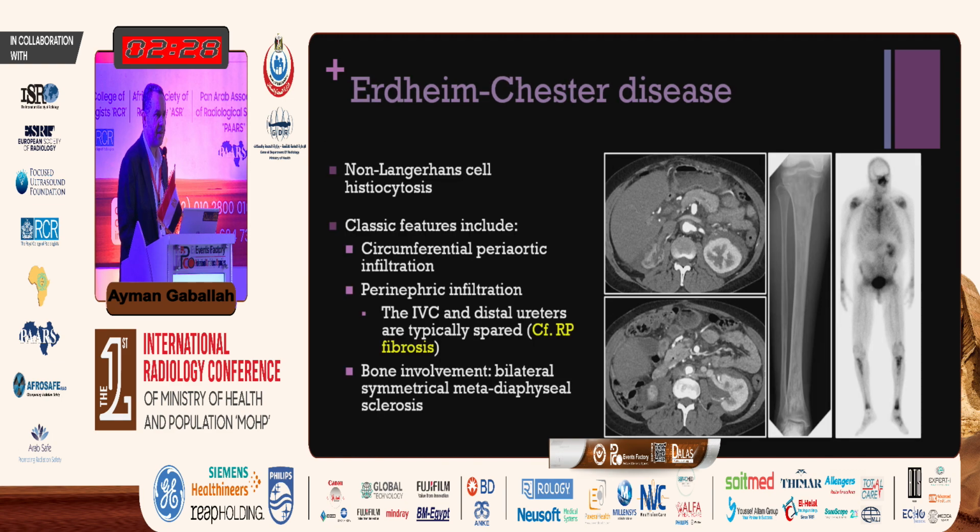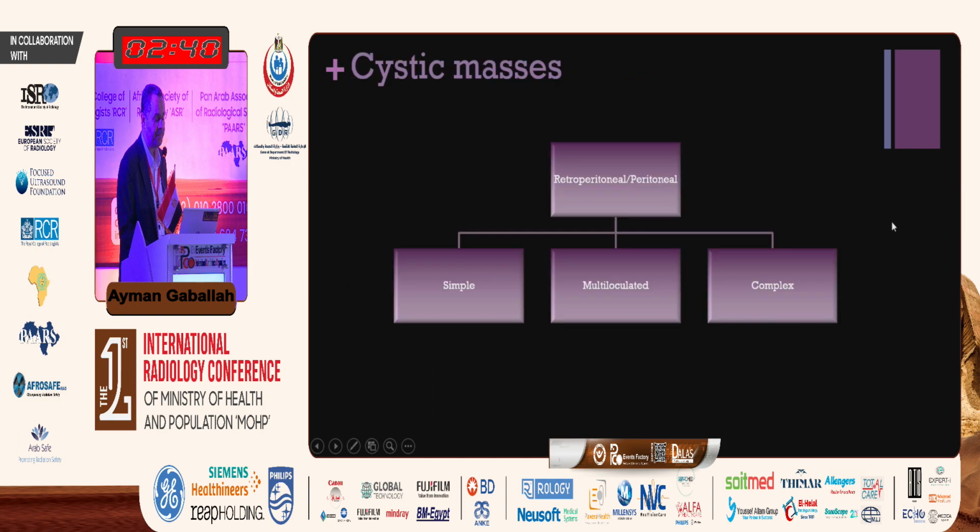Hopefully you guys are familiar with Erdheim-Chester disease. It's a very similar disease, an infiltrative process around the kidneys, but they also have other manifestations because it is a systemic disease, like sclerosis in the diametaphyseal regions, as you see here in the bone scan.